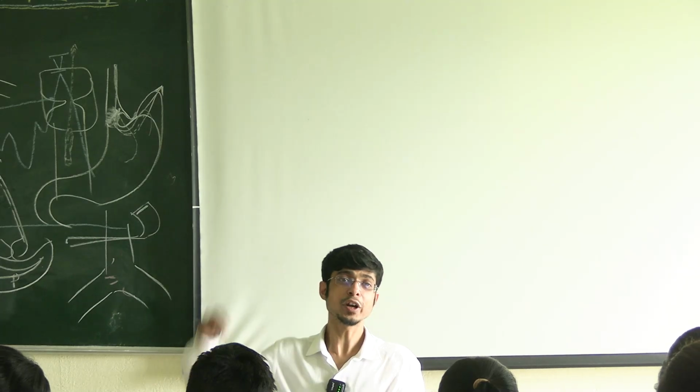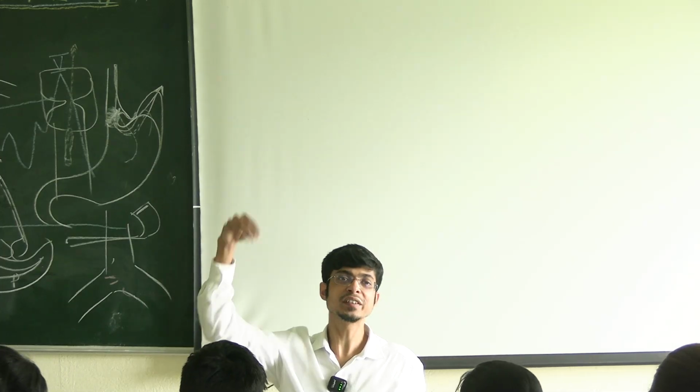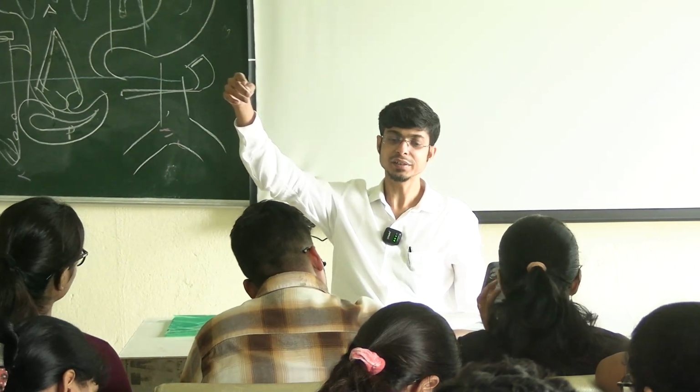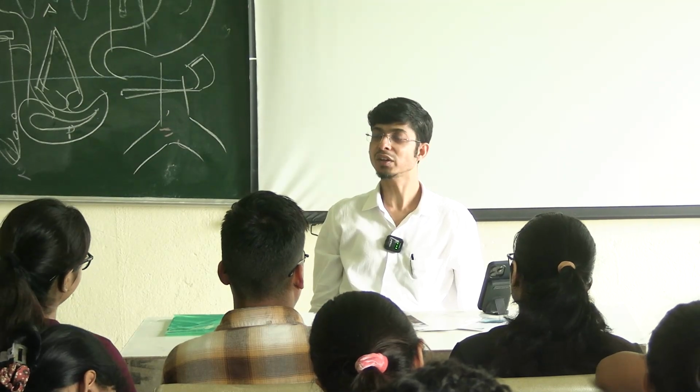So if there is a foreign body impinged in the pharynx or stuck in there, it will cause an inflammation, and there will be infection associated because you are breaching the mucosa. The infection will go in posteriorly and will cause an abscess in the retropharyngeal space. Other than that, what can be other causes? So what is the content of the retropharyngeal space?